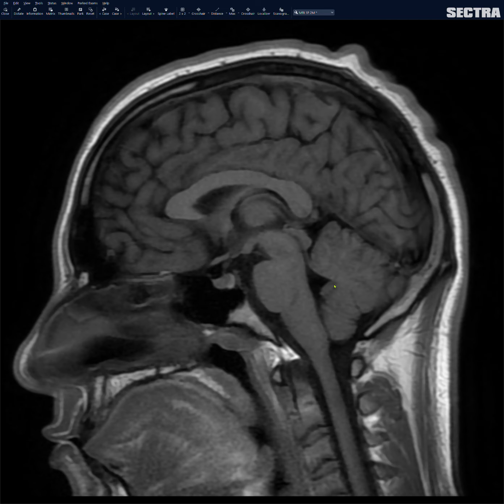On the T1 sagittal, I look at the cervical cord, the brainstem, and the cerebellum. Always make sure that there's no Chiari malformation or tonsillar herniation. Look at the prepontine cistern. I look at the suprasellar cistern, make sure that it's present, not effaced. I always take a look at the pituitary gland and the sellar and suprasellar regions, make sure there's no mass. Look at the thalami, the fornix, the corpus callosum, and the cerebral hemispheres.